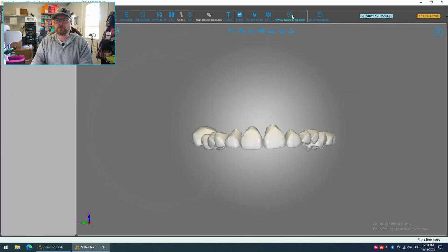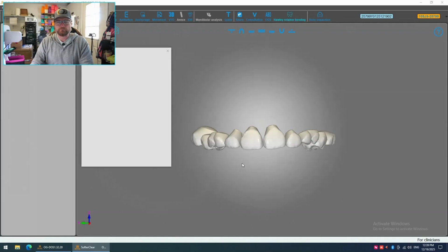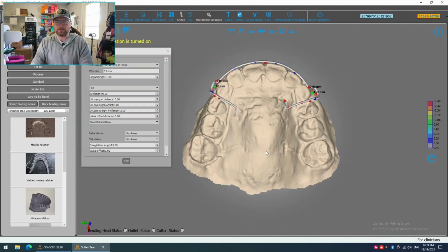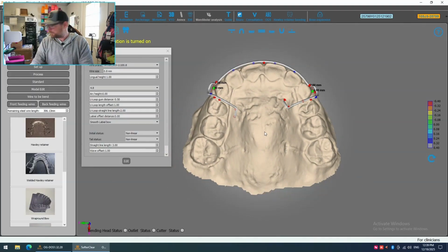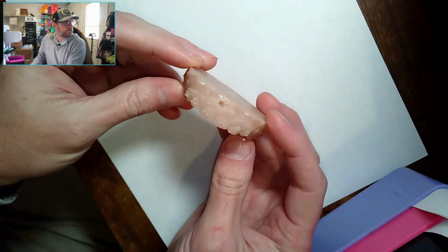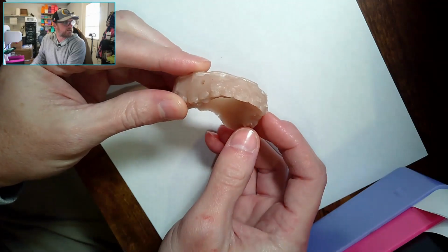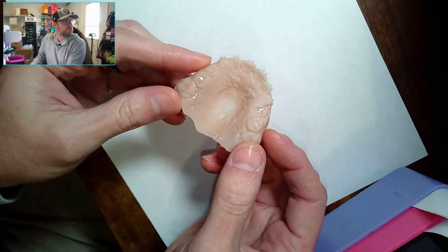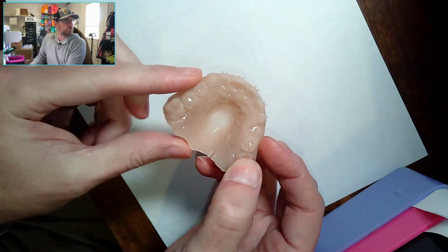Let's go full screen so we can see it. And we're just going to click on Hawley retainer bending. And there we go. You see the RPE is still imprinted on the thing. So the model, if you look at the model, oh, wrong one. This is a printed model from the doctor, but when they submit it, they attach the scan anyway. So I took the scan, sent it through auto bracket removal, and then moved on, and then uploaded it.